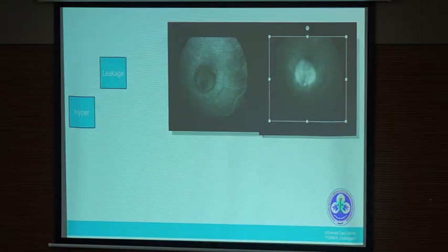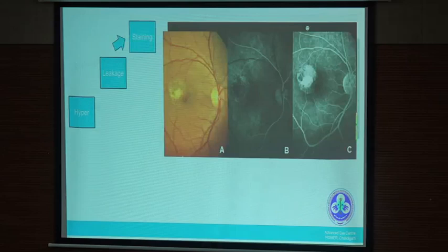We teach you that in the CNVM case. Then there can be staining there. If you have this kind of tissue or a healed scar there, it can be a staining. Again, there is a staining also, and there is a tissue which was hypo initially and becoming hyper later. So this is again a staining happening there.